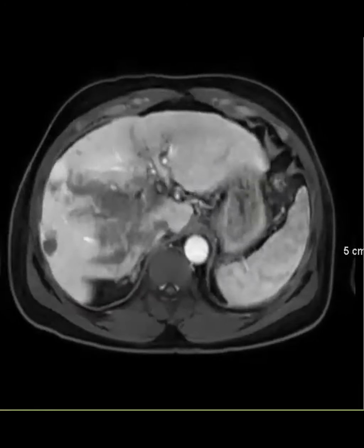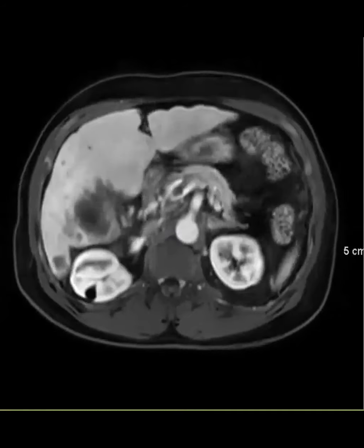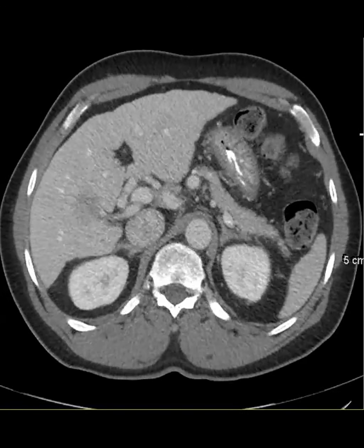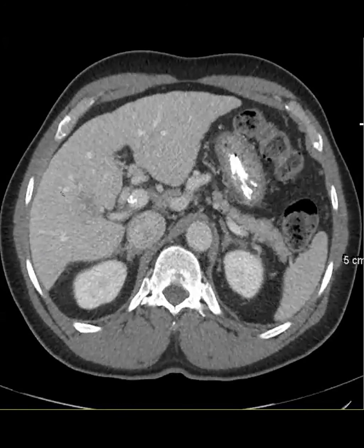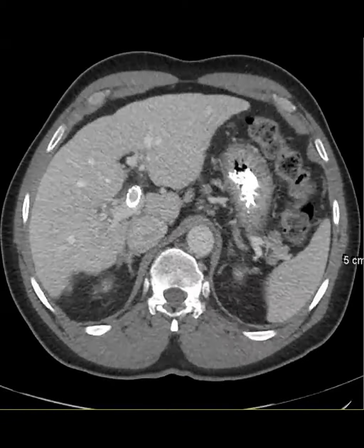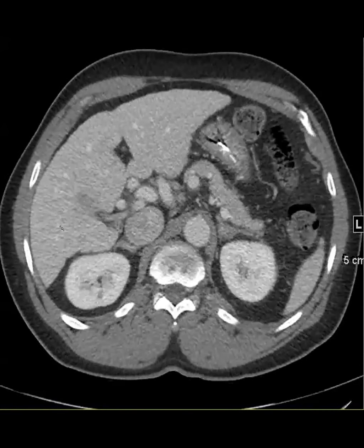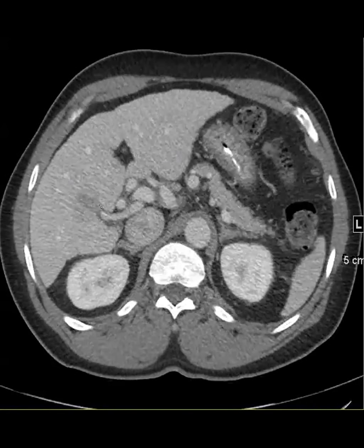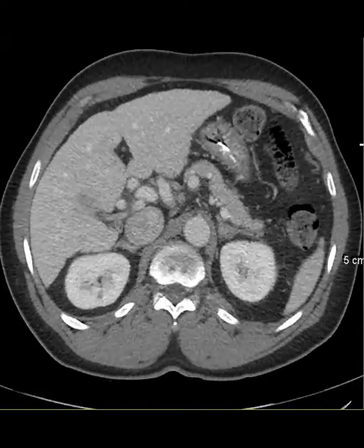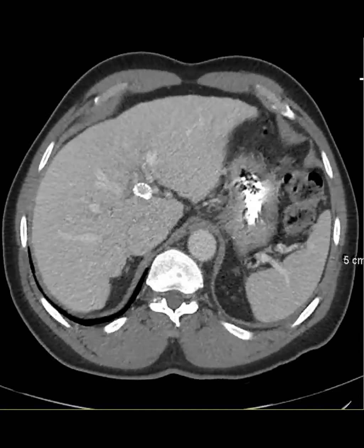So it's a hard balance between overcalling and undercalling. But in this case, the main point is that a new area of focal fat in a patient with advanced cirrhosis is a very unusual or unlikely situation. So you should reconsider and go into the table, or if you felt this is a small infiltrative mass, that would warrant the LR-M category. So at the very least, this should have been followed up at a 3 months interval.